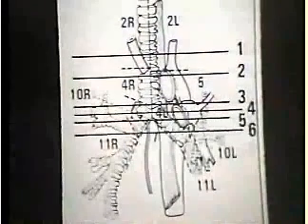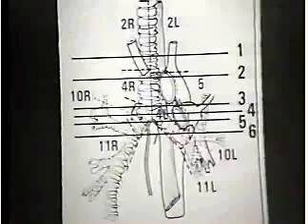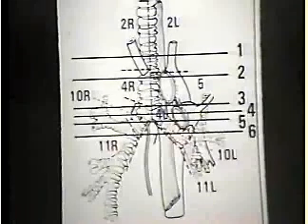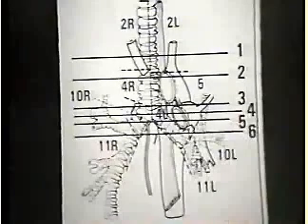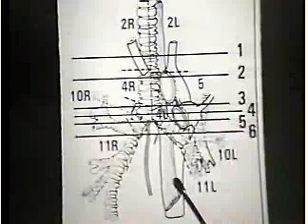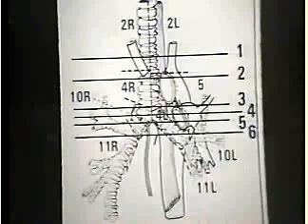Well, we're back to the beginning again, and I wanted to reinforce the fact that we have looked only at what I think is the most clinically important portion of the mediastinum, really defined by these 6 cuts that we have used as representative diagrams. Findings further down in the esophagus, hiatus hernia, and so on are easy to work out, and we're not going to spend any time on those. Aneurysms of the aorta are another interesting subject, which we will not have time to deal with.